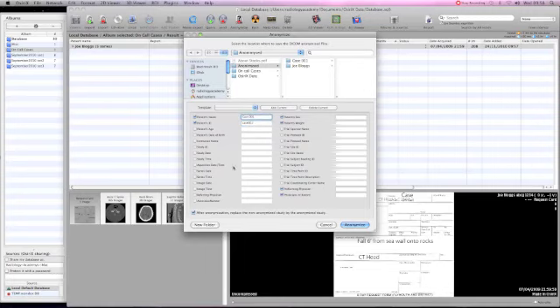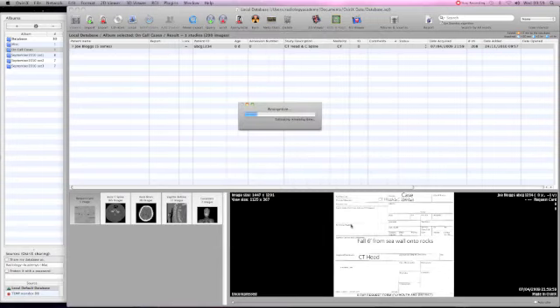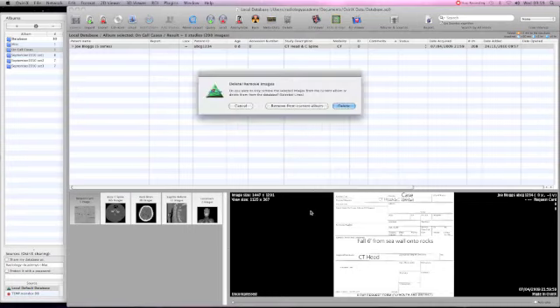You can see that at the bottom of this screen there is a box to be checked, which we've checked in this case, which says that after anonymization the original file will be replaced. If that's checked, it will replace the original folder for Joe Blogs automatically. So if you anonymize, it'll then give you two further options.